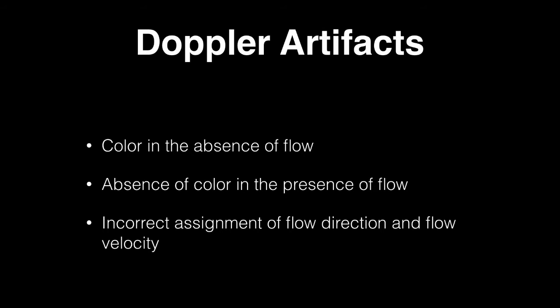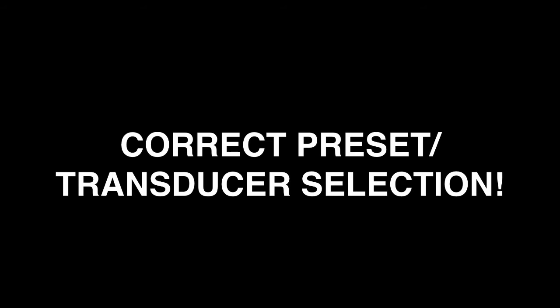You may end up with absence of color in the presence of flow if you have incorrect settings, and you may have incorrect assignment of flow direction and flow velocity. First and foremost, make sure that you use a correct preset and you choose the appropriate transducer.